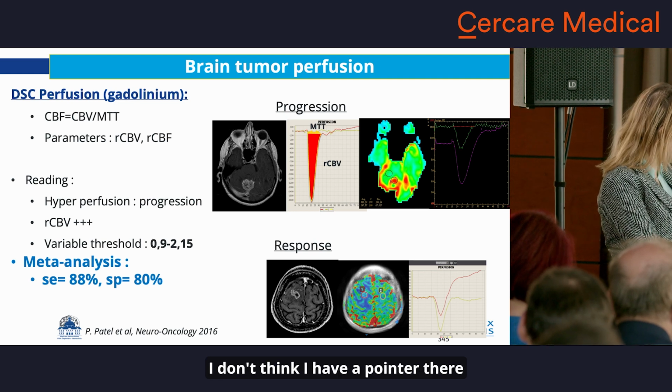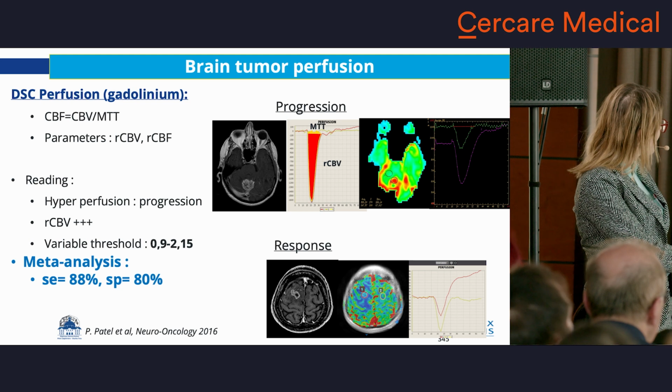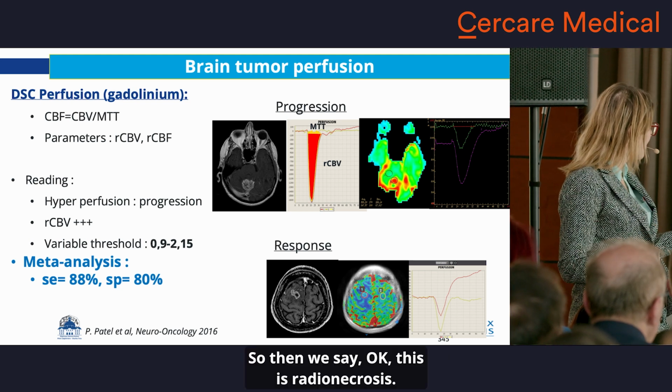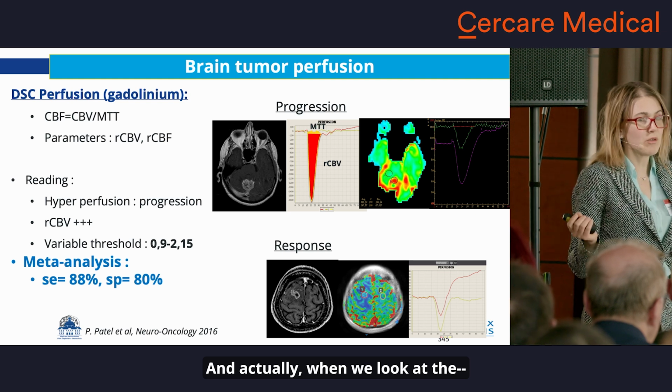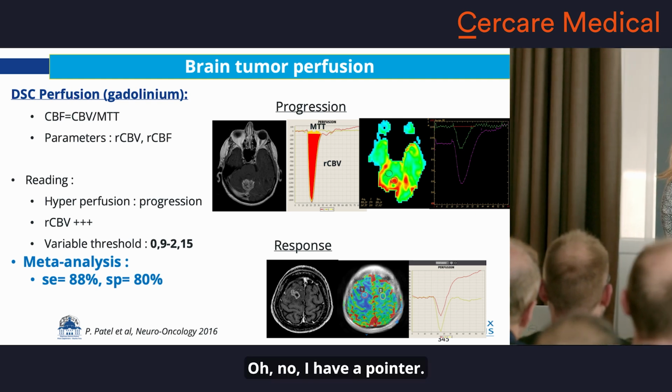I don't think I have a pointer. Down the images, no, we don't have the pointer, okay. So then we say, okay, this is radionecrosis. And actually, when we look at the, yeah. Oh, now I have a pointer.